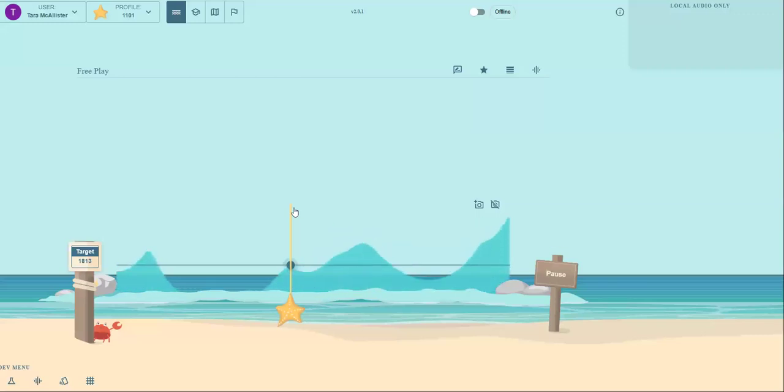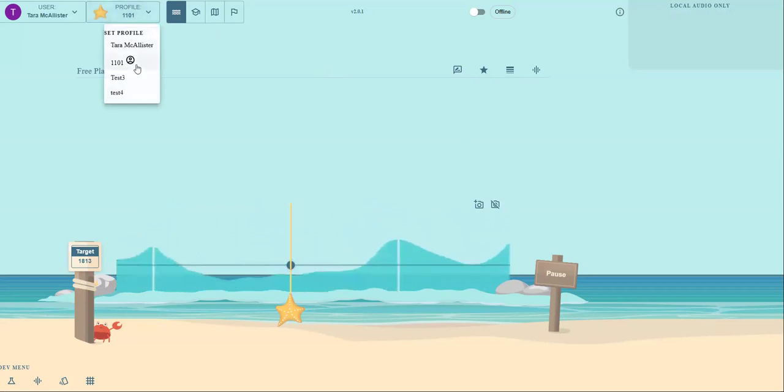We teach our users to focus on the third peak and try to move it over to be close to the second peak. The starfish slider represents a target for the third peak. By default, it's set to a frequency based on information about age and sex of the client that the clinician entered when creating a profile for them.